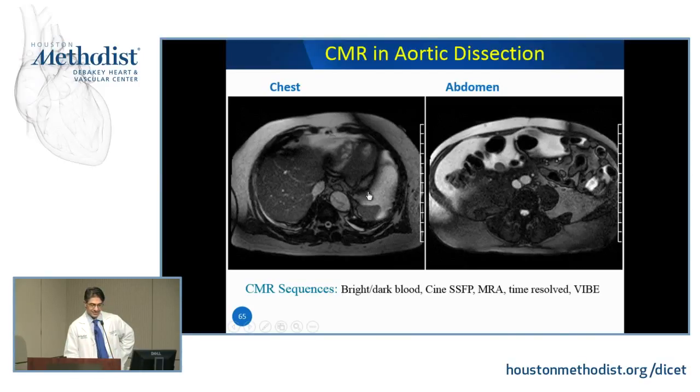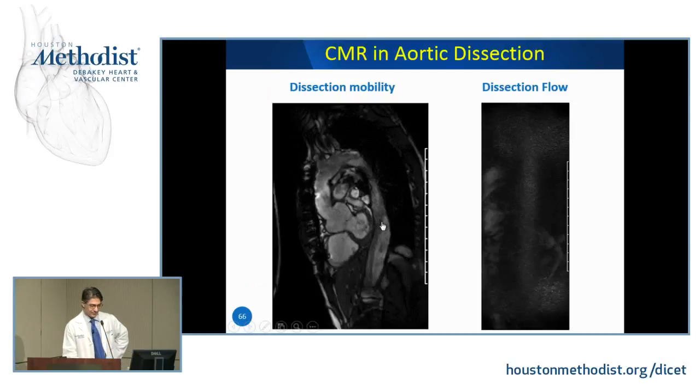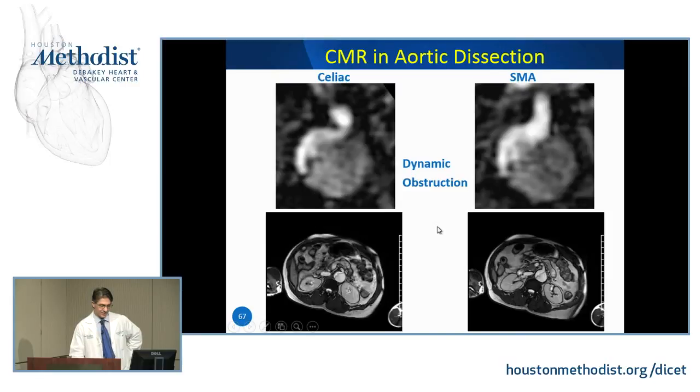I'm so sad it's not playing here, but it was really an amazing case, which, Akshay, you'll be reading today. It was a very nice type B dissection, and you had a retroesophageal right subclavian, and you can see the dissection going into that as well. I'll figure out why this didn't work. I'm really disappointed. And it's the same story over here.